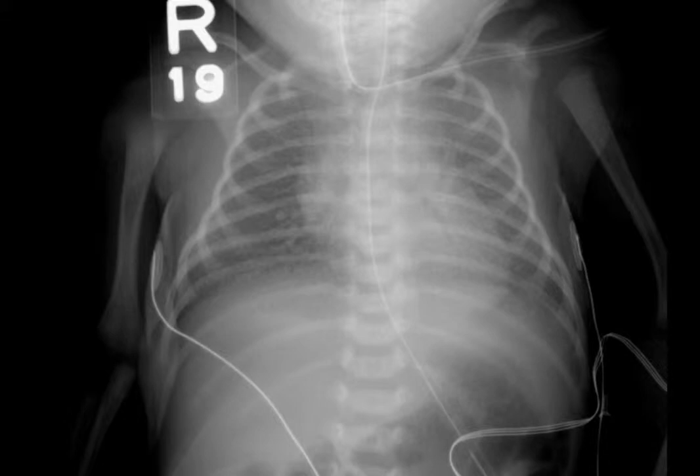A more common appearance of interstitial emphysema is to have either small cystic or linear areas of lucency. And this case right here is probably the most important one for you to remember. If you look at the lung bases in this patient, you might think that you're looking at air bronchograms in this area. But if these are air bronchograms, you ought to see the exact same number and size of air bronchograms in the corresponding area of the contralateral lung. So this, to me, is an example of very early interstitial emphysema, probably in the right lower lobe, because it does not look the same as the same area of the left lower lobe.